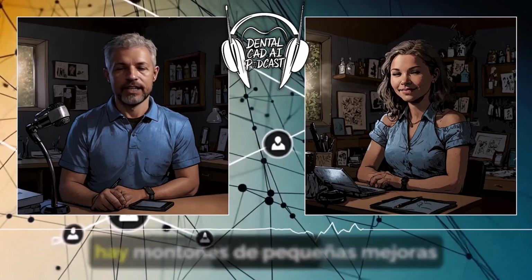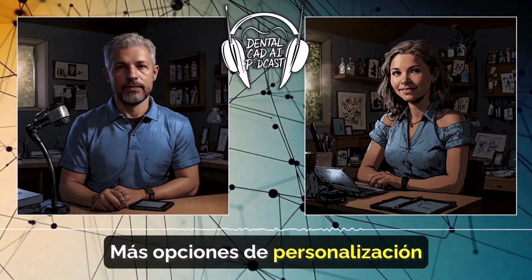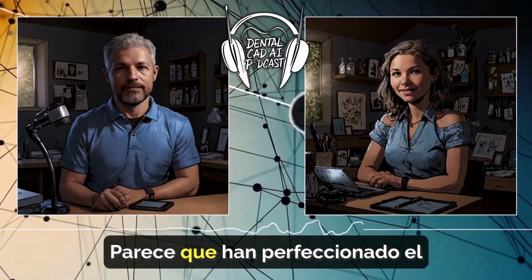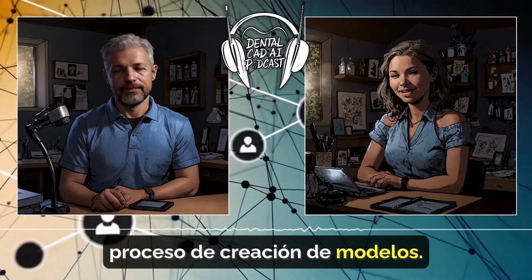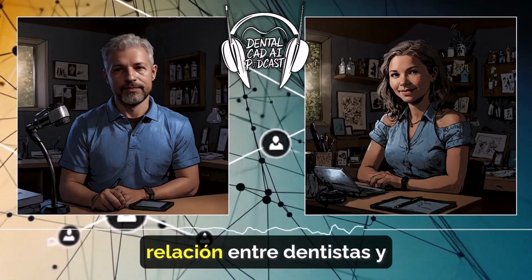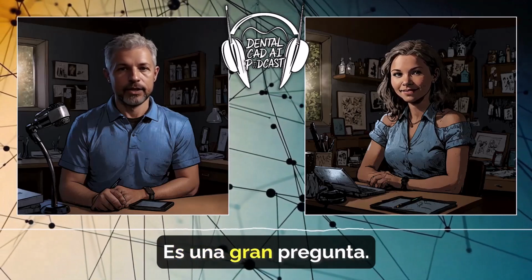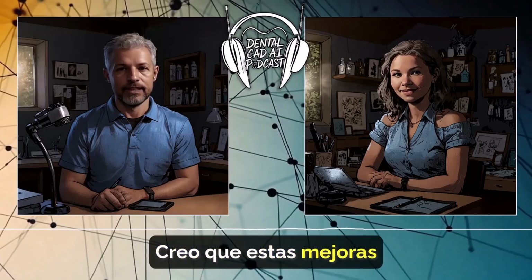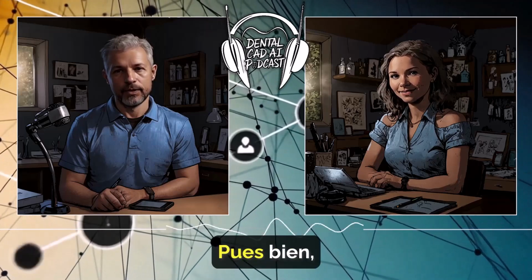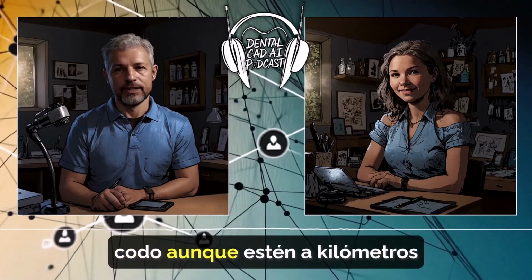Absolutely. Yeah. And beyond that, there are tons of smaller improvements in the model creator. Like what? More customization options for individual dies, better support for different 3D printers. They've really thought of everything. It sounds like they've really fine-tuned the whole model creation process. Yeah, they really have. It makes me wonder, with all these advancements, how do you see this impacting the relationship between dentists and lab technicians? That's a great question. You know, I think these improvements will foster even stronger collaboration between them. How so? Well, with the ability to share detailed 3D models and communicate in real time, it's like they're working side by side even when they're miles apart.